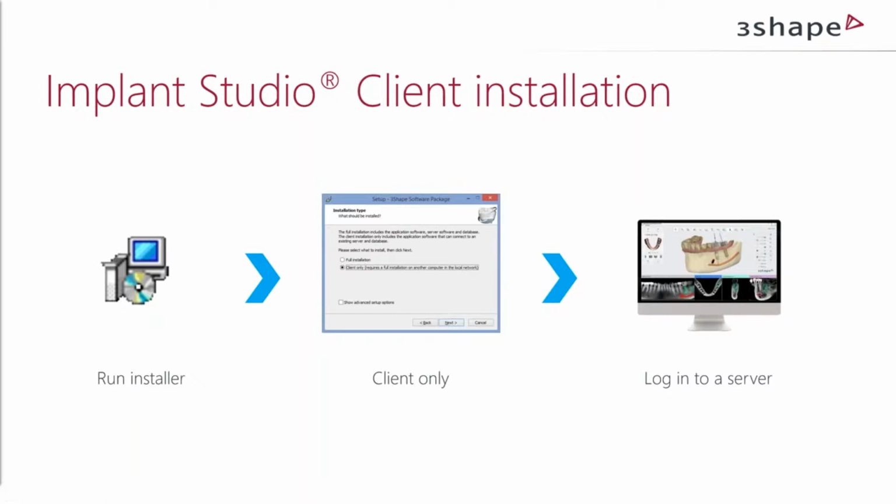So the dongle is required only on a server PC. The dongle is not required during the client installation. Okay, let's take a closer look at it.